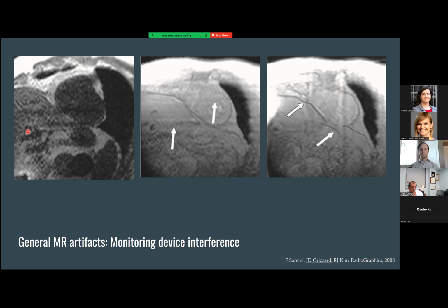And in the far right image, you can appreciate a decrease in the signal that is parallel to some increased signal here too. So if that's going right through a potential area where we're concerned for hypoperfusion, it may be detrimental to the quality of our image scan.